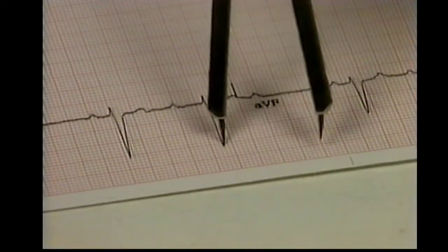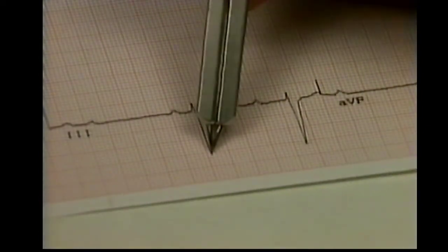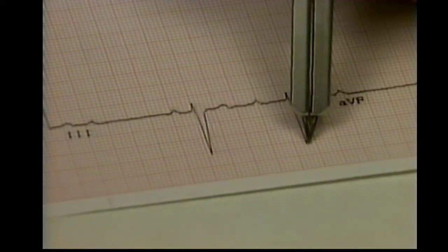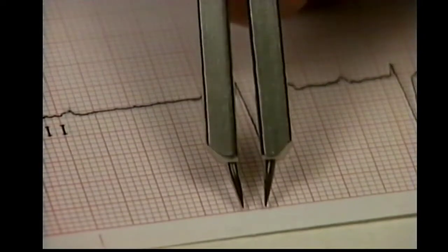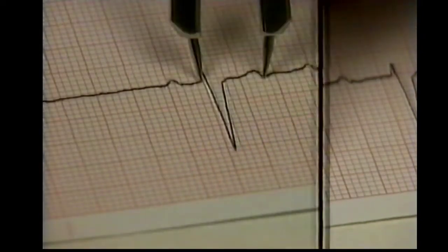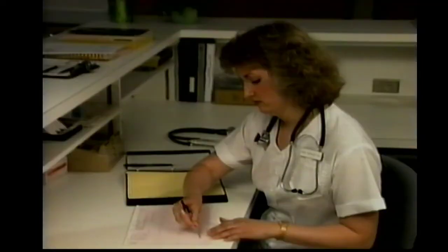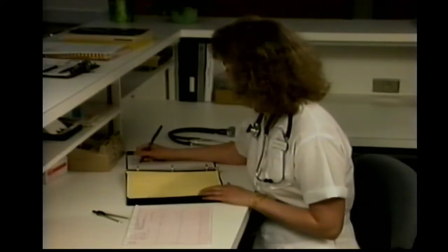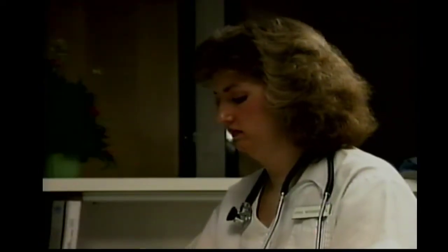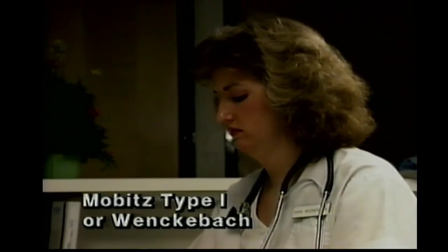The ventricular rhythm is irregular. The ventricular rate is about 40 beats per minute, which is less than the atrial rate. The QRS complex duration is 0.12 second. The QT interval is 0.34 second. A diagnosis of second-degree AV block has been made by the cardiologist. This type of second-degree block is called Mobitz type 1, or Wenckebach.